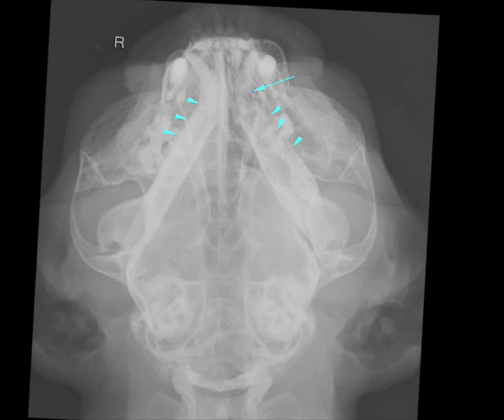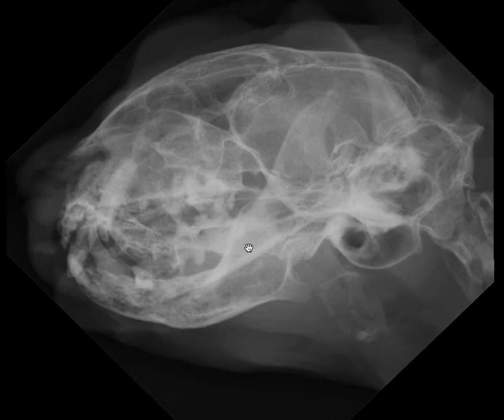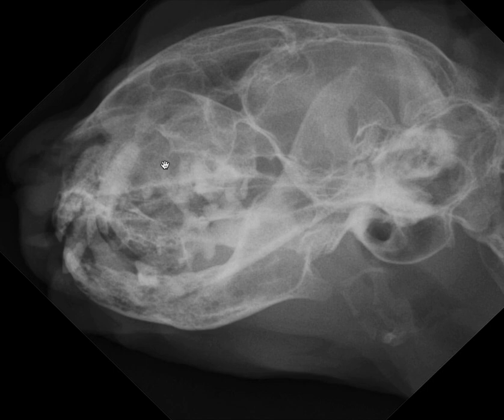Whether it's a skull radiograph or any other body part, anything that I see on one view, I always want to corroborate using other views. The challenge with skull radiographs, and the reason we all find them so hard, is it's almost never possible to get the areas that we're interested in without having lots of other stuff superimposed. So if I wanted to use the lateral view to help me assess the opacity of the nasal cavity, because the nasal cavity between right and left sides is superimposed, it's much harder for me to make a conclusion.